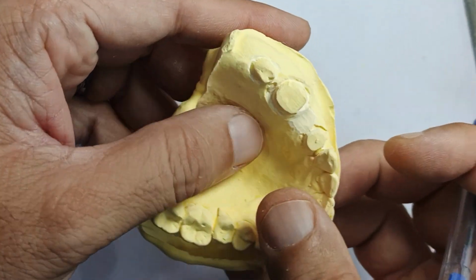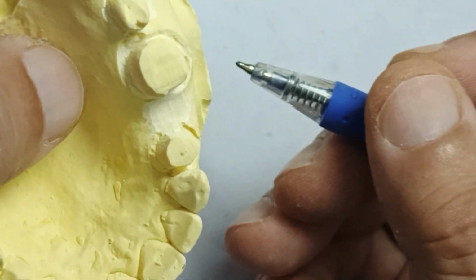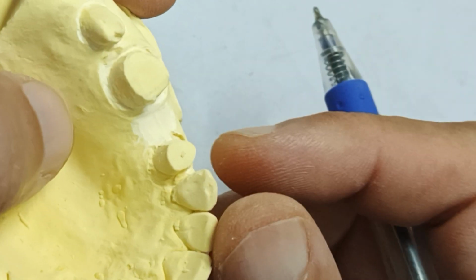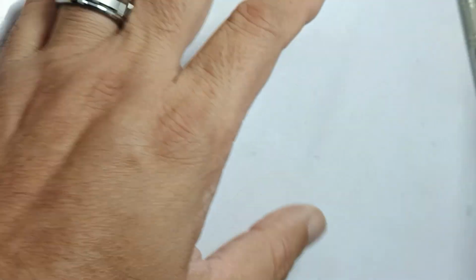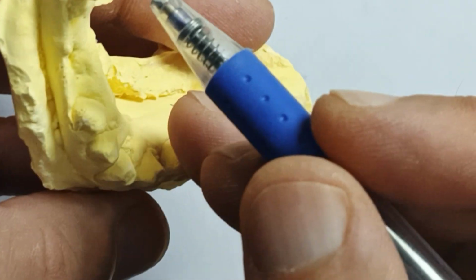And look at this one. Wonderful. Where is the prep? And with this money we're going to go do Qurbani. And this is halal earning. This is pure haram. The book never says how to do these preps. Now take a look at these. There's a bubble right at the margin of this horrible prep.